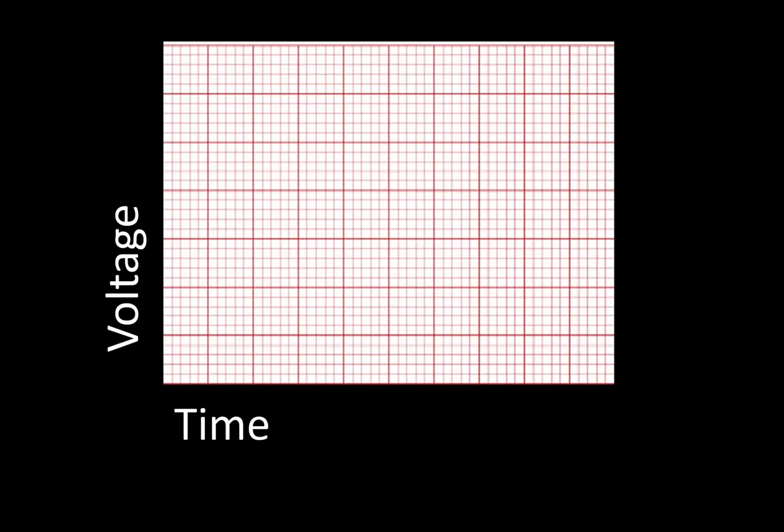All right, so this is a basic EKG grid, EKG paper. This is very, very standard. Pretty much all of them work exactly this way. And the idea is this. You have time along the bottom traveling this direction, and voltage traveling up. So the time portion of it, each small box, so we tend to measure this in seconds. And so each small box right here is worth 0.04 seconds.